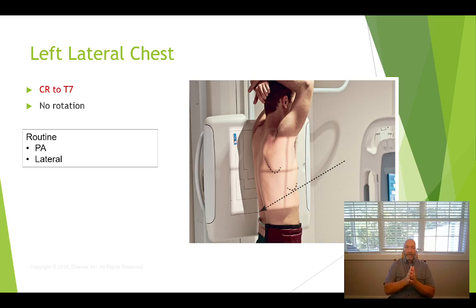So where you get into the periphery of the X-ray beam, you've got an angulation, and what that means on the X-ray is that whatever's furthest away from the image receptor is going to move the most. So your left lung being close up against the image receptor is going to be less affected by the divergence of the central ray than your right lung.